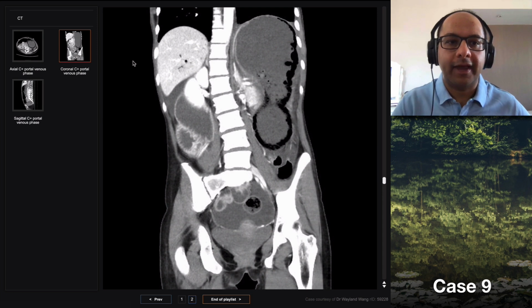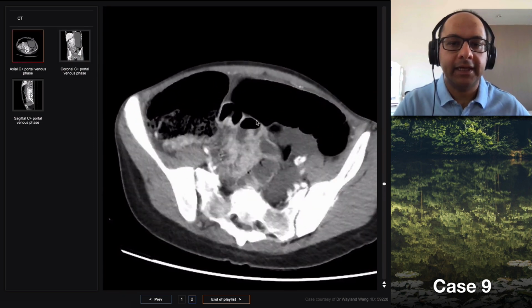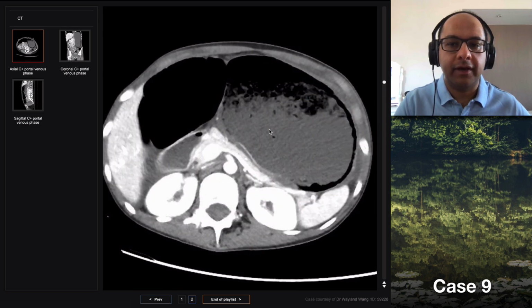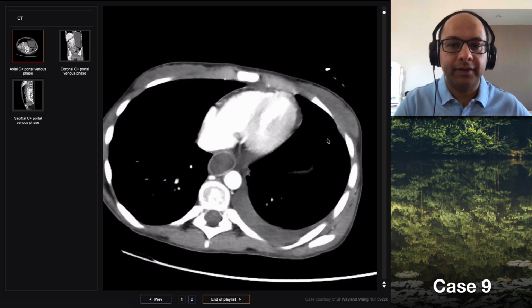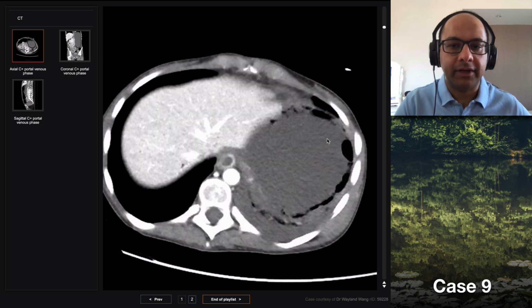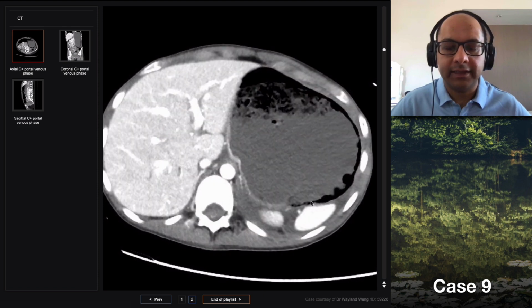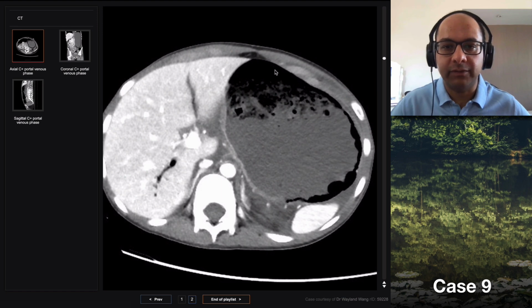Thank you. Okay. Let me talk through this. So basically, we had the history of this consumption of an entire pizza the night before. So this is a case of gastric ischemia. Okay, so here as we scroll this, as you said, there is gas within the stomach wall. I know we haven't got the lung windows, but it's following the contour. So this is gastric pneumatosis.